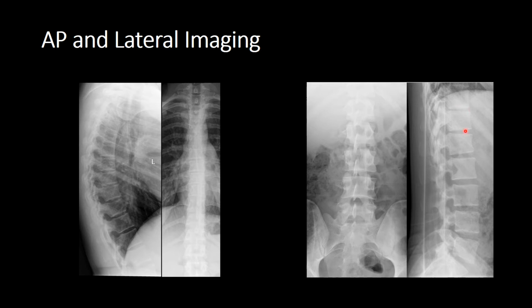Check your intervertebral disc spaces, make sure that they are in alignment, that there's no diastasis or narrowing. The L5S1 intervertebral disc space tends to be slightly narrower than the remaining lumbar disc spaces, as are the thoracolumbar and the thoracic vertebral disc spaces. Look around your pedicles, and then specifically look for your pars interarticularis. Assess your facets, check your ribs, go around your spinous processes.